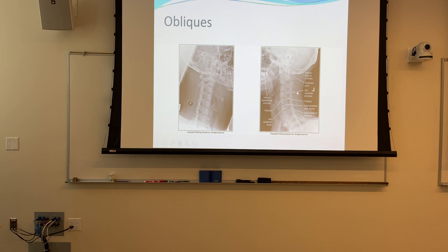Our lock facet will look like you put a layer of shingles in the wrong place, right? It looks like you started off well, working from the bottom up, and then at some point you decided to go from top down, and you're essentially overlapping your shingles in the wrong direction. So what we'll have is, instead of this overlapping that, this will be anterior to that, so that water could run into your house, so to speak, right?